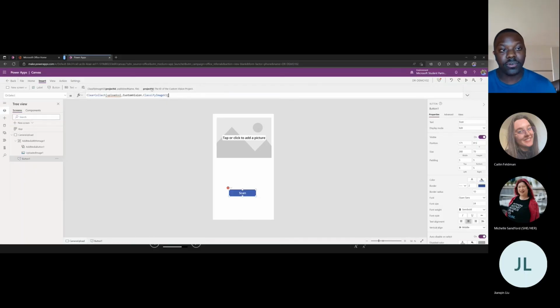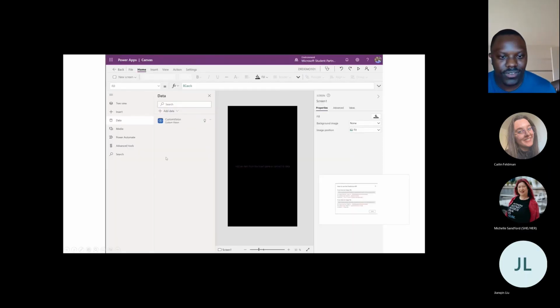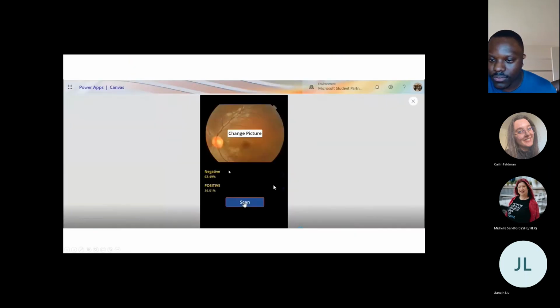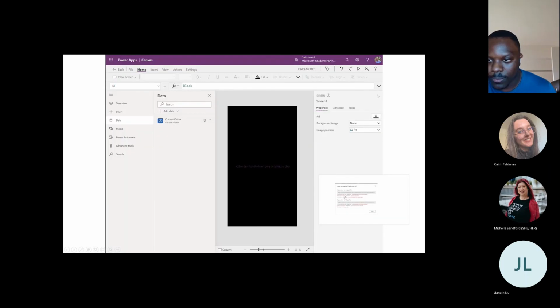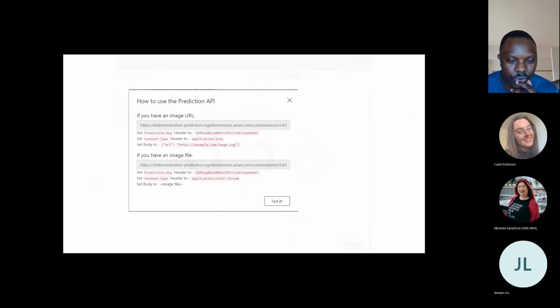And so what we need is the project ID. Now, project ID, I did show you earlier where we get this information. I'll just work with this one. So to get the project, this will be used for the connector, but to get the project ID, I'll just show you where it is. So this is the project. No, it's not that one.